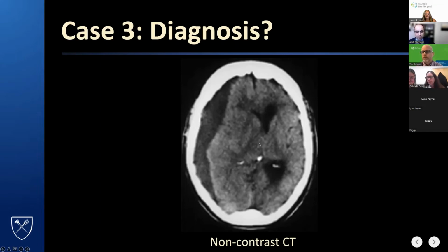And so this is one of the things that we're looking out for, because patients may present with neurological complaints or may present with cognitive complaints from this. And this is something that is potentially a treatable cause through drainage of the subdural. So excellent job. And so the options, a hygroma or a hematoma, sometimes difficult to tell.